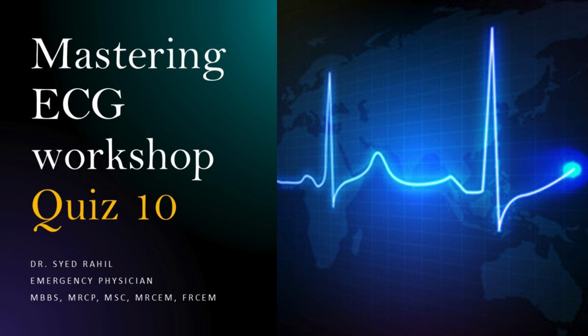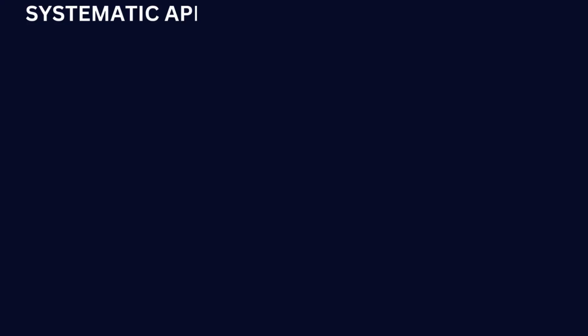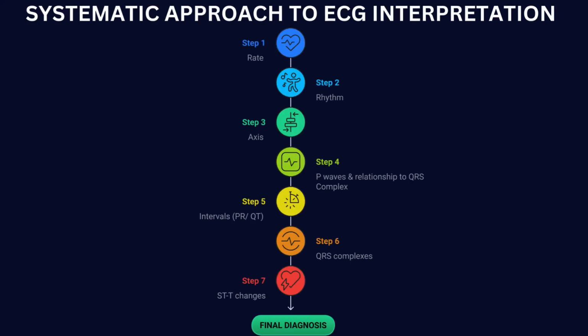Today I've got a new ECG challenge for you. We are going to use a 7-step approach to interpret an ECG. So grab a pen and paper and let's get started.